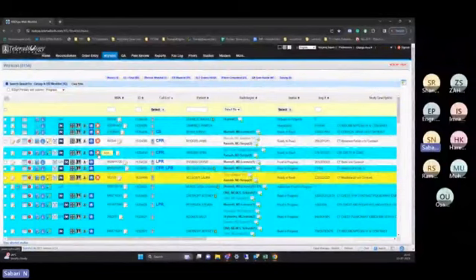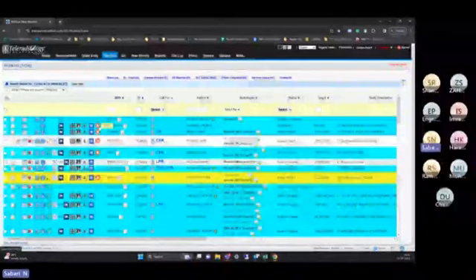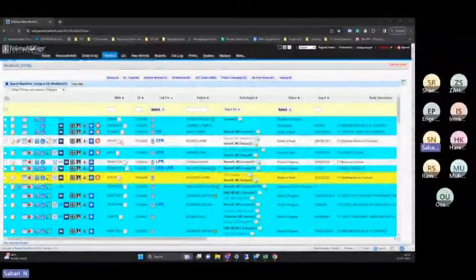Once everything is tested, because why would I want to keep my test studies in this application, you can use the abort option to delete the study permanently from the server. Automatically it will get deleted from your storage, from the database, and from the application as well. So nowhere will that study be visible. That's why we are using the abort option.